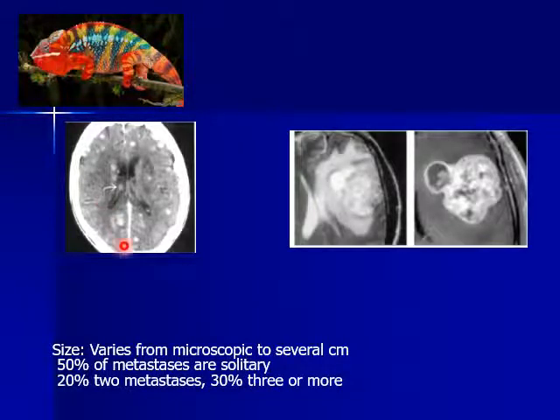It can present as hyper-enhancing nodules that usually love the area of corticomedullary junction. It can also present as a solitary lesion with cystic changes and hemorrhage simulating glioblastoma multiforme.